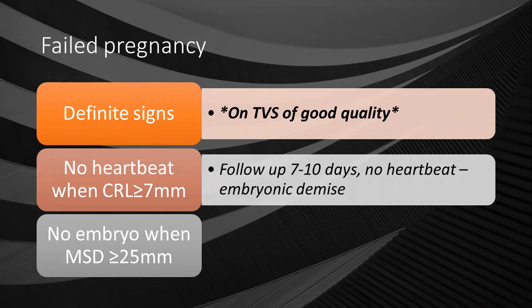But unfortunately for that pregnancy, after about a week, the patient came back. Now the heart signal was there, strong as ever, but she now had a subchorionic hematoma threatening the pregnancy. The heartbeat was still there, strong. The patient was given bed rest, but eventually the pregnancy miscarried, so it had a poor prognosis.